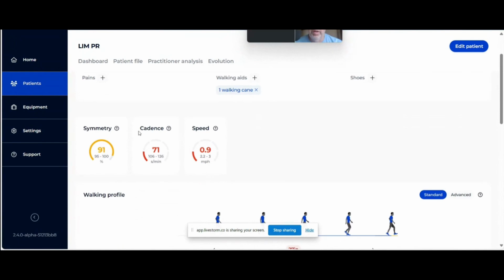We may do this with some of these particular people. So remember that we use a color orientation as part of the readout to make it faster and easier. As you get good at evaluating these, kind of like if you've learned how to read X-rays or blood reports or EKGs or EEGs, we're looking for the things that really stand out, and we get used to what's normal. So if it's in amber, that means it's sort of in the middle. If it's green, it means it's one or less standard deviations away from the normative values that we have with that particular patient.